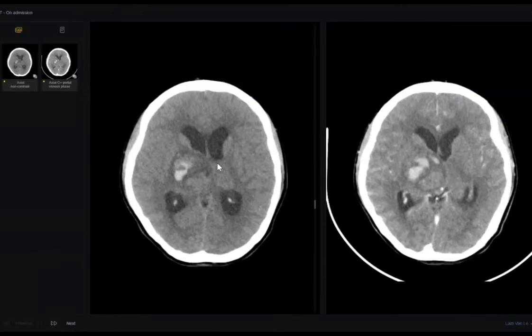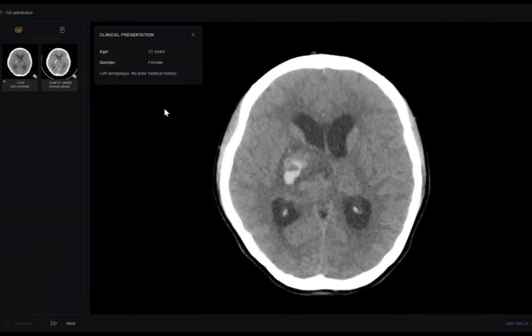Okay, I will revise it again, using some Arabic words, please, because it is very difficult and maybe a new case for some people. What happened? The examiner gave a very misleading case, because in the beginning I told her the patient has sudden left-sided hemiplegia. I said that on purpose, I mean that to mislead her.